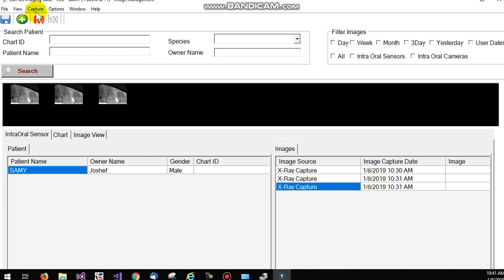Please stay tuned. There will be part 3 where we'll show you the rest of the features like calibration and image quality enhancement, because the image quality largely depends upon the kind of X-ray machine and the environment you have. For example, you might be using the positioning ring, which might impact the image quality. For that, we have to apply the calibration to subtract the effect of the positioning ring. For all those kinds of features, please stay tuned.